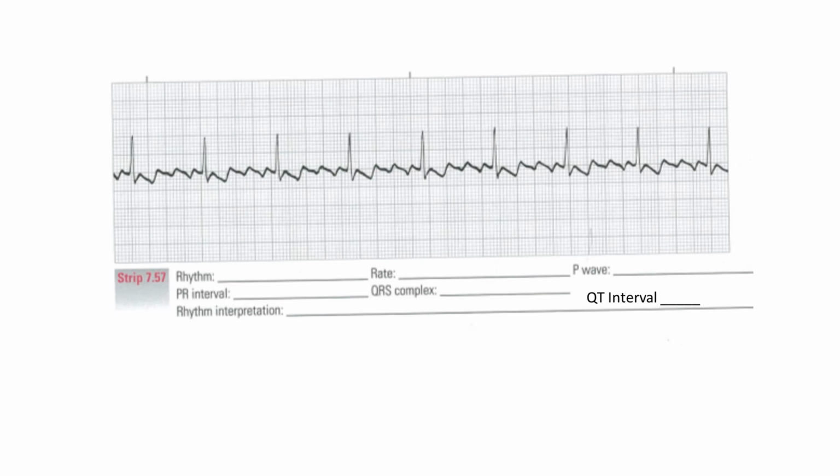7.57, and this patient, the R to R is actually considered irregular. Your atrial rate, if you checked it, it's about 5 boxes apart, so that would be 300. Your ventricular rate is, I think it looks more regular, not irregular, excuse me. So the ventricular rate I think we got is 75, about 20 boxes in between.